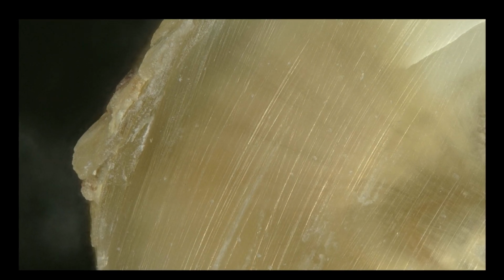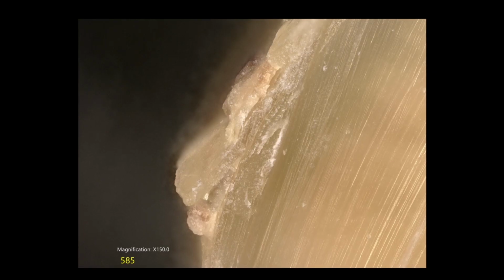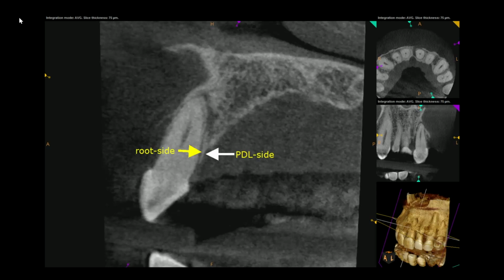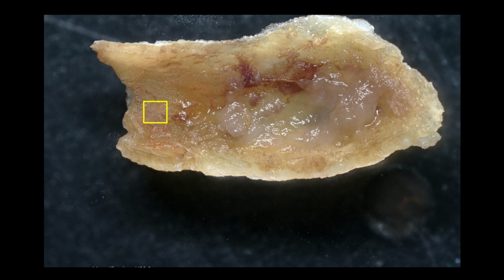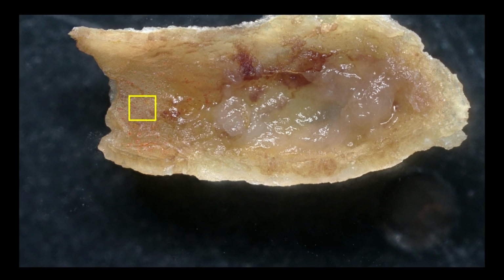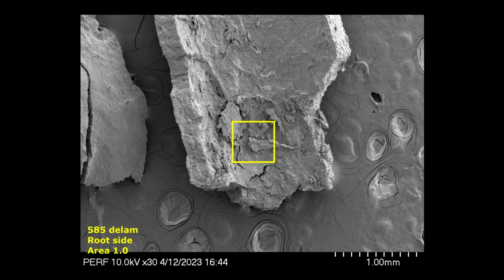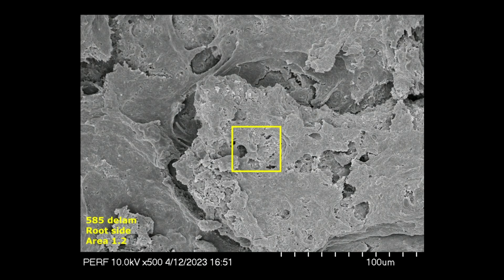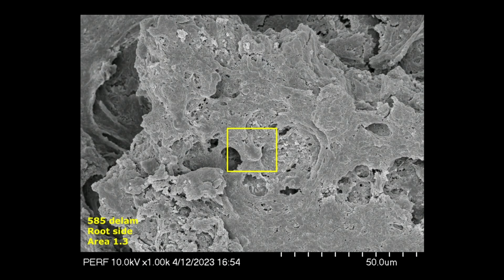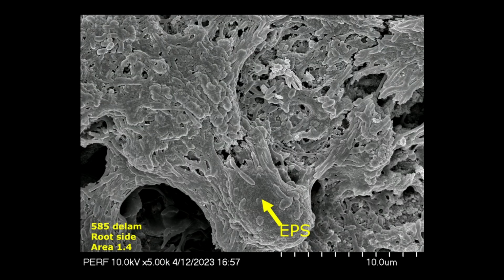And after it was dried, if you just touched the cementum, it had a tendency to flake off. This is the axial view. And my hope was we could look in there and maybe learn something about the etiology. But we were not really successful in learning very much by doing that. But I'll show it anyway, just so you can see that sometimes science is completely unsuccessful. So this is the root side. And when you go into it, it's actually a very good exercise if you're trying to refine your pattern recognition on what biofilms look like.